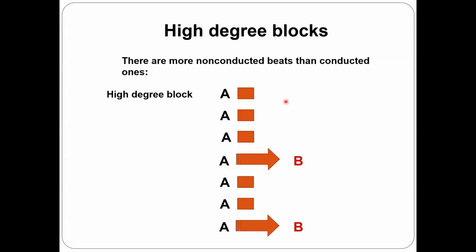Now, this, again, is rhythmic. So, first degree AV block is rhythmic. Second degree AV block, not rhythmic. 2-to-1 AV block is rhythmic. High degree is not rhythmic, because whenever we do have a conduction, that makes it arrhythmic. Because if we do not have conduction between two points, it means that the lower center is taking over and you have an escape rhythm. And once we do have a conducted beat, that makes a slightly faster coming beat.